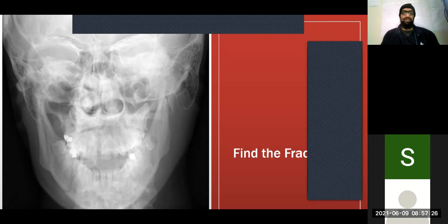All right. So it's quite important to look at the entire X-ray. It's very easy, for example, to get lost in something like this and say, there's a massive fracture, and I forget to look at the rest of it. So whenever you have a patient and you find one thing on an X-ray, don't just stop. Carry on. You'll be amazed what you can find. Is this patient also at risk? Yeah, this patient is also at risk. It doesn't mean that they will definitely have airway compromise. That's not what I'm saying. But what I'm saying is there is a possibility of airway compromise.